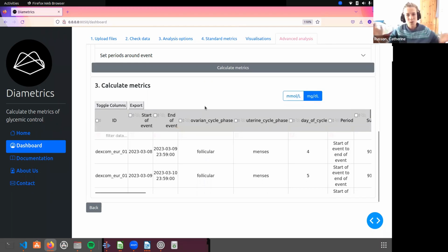So yeah, I hope that was helpful. Like I said, this was a real whistle-stop tour. So please check out all of the individual videos below to get a much more in-depth understanding of all of the different features of Diametrics.